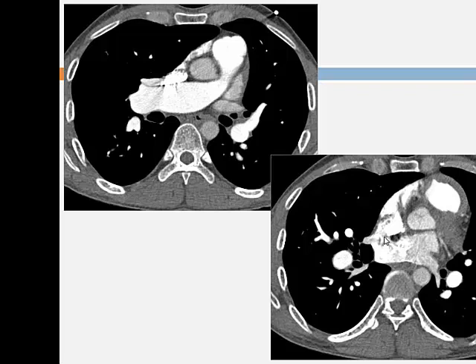And then obviously you look at the pulmonary artery. Is the pulmonary artery big? That will give you some clues as to whether it's pulmonary arterial hypertension. And then obviously, if the PA is normal and the right heart's big, then you can start thinking about primary right ventricular cardiomyopathies like ARVC.